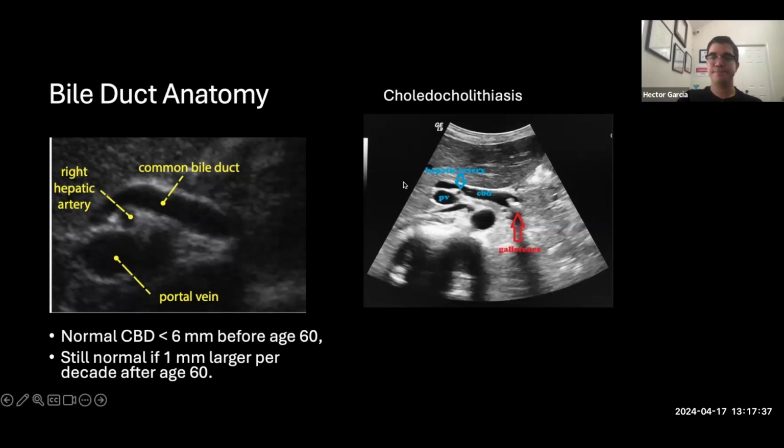And right here in the picture, I want to represent the next diagnosis, choledocholithiasis. Here we see a stone, again, what I mentioned previously. We see echogenic material that is very bright, hyperechoic, and we see posterior acoustic shadowing, meaning this shadow behind the stone, and that's because the echo cannot go through the stone. So it leaves this imaging artifact that is actually very pathognomonic for stones.